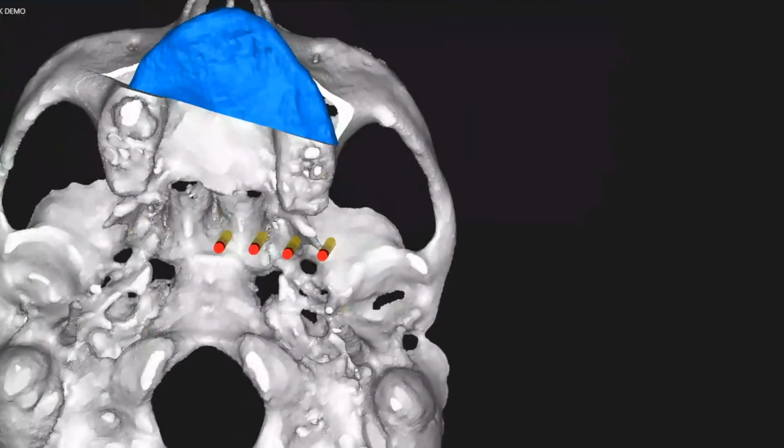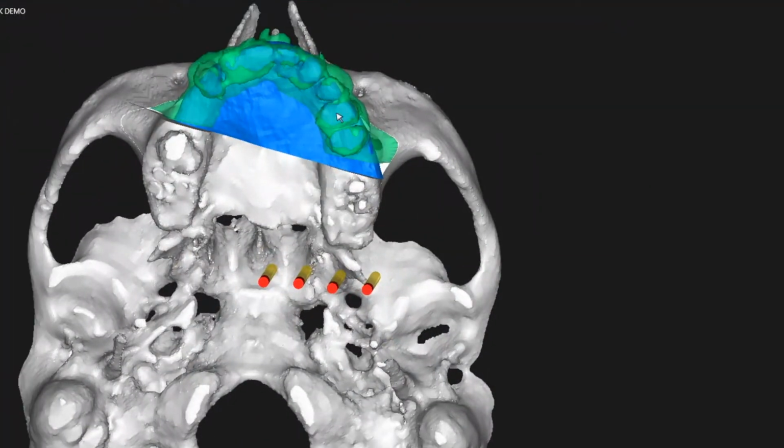Let me bring in the resected. So just 2 on either side, or do you want 2 more in the front and then 1 on either side? If we can have 2 on either side of the midline and 2 further posterior to that. Okay.